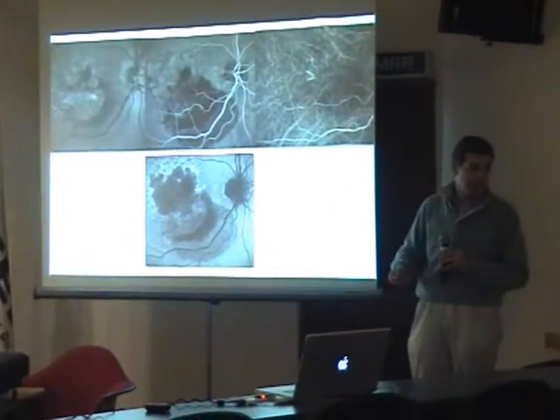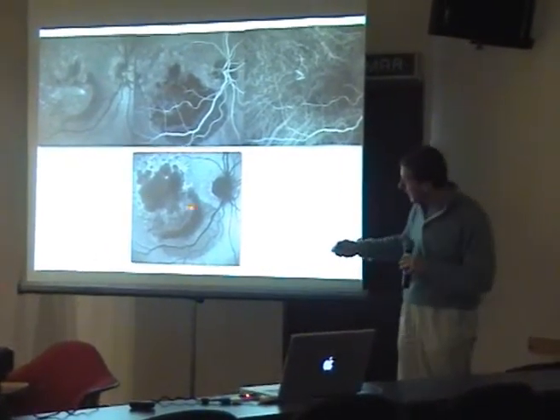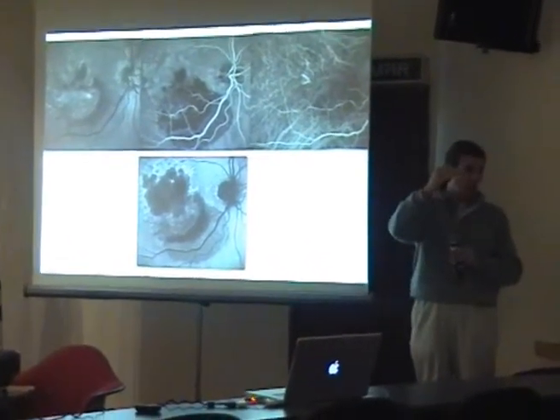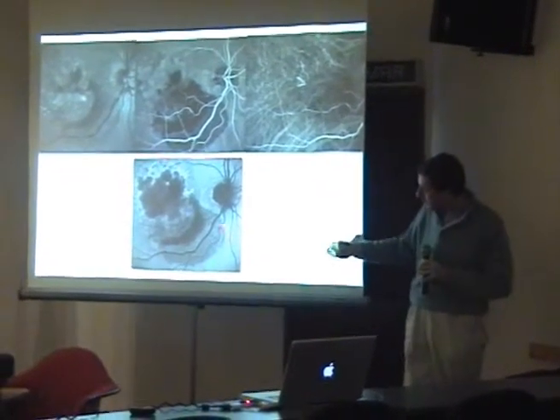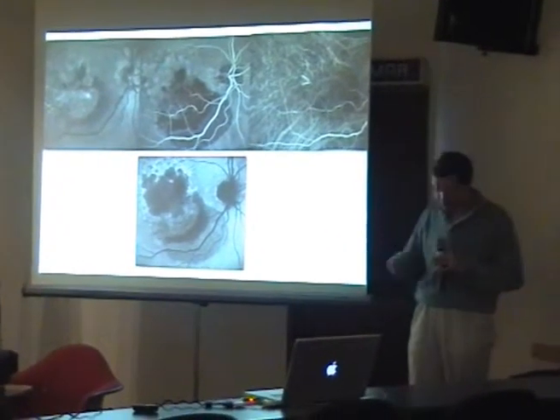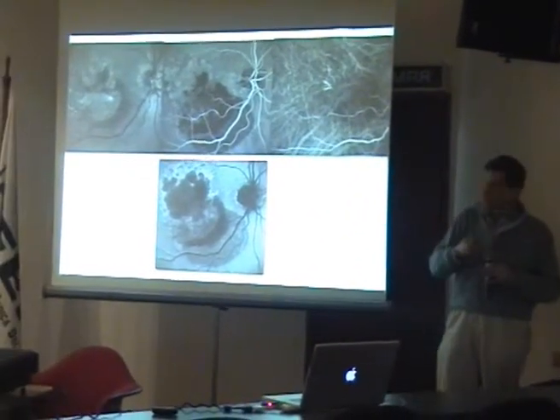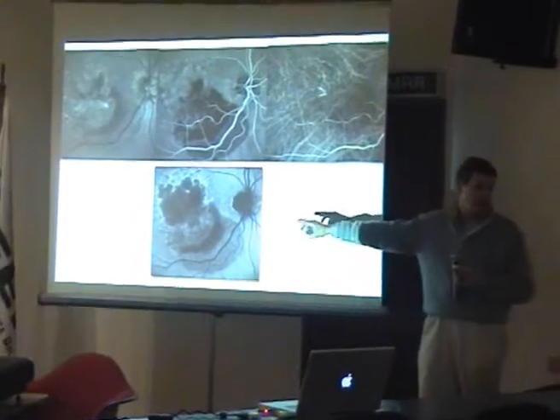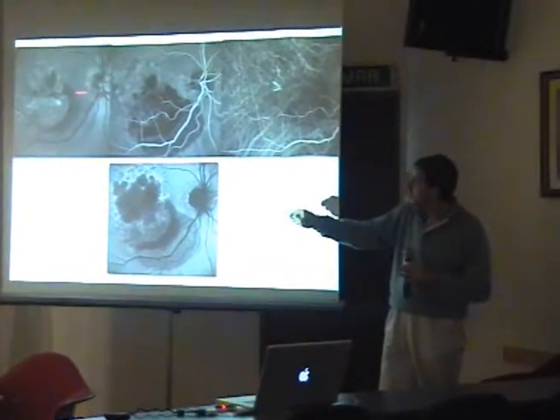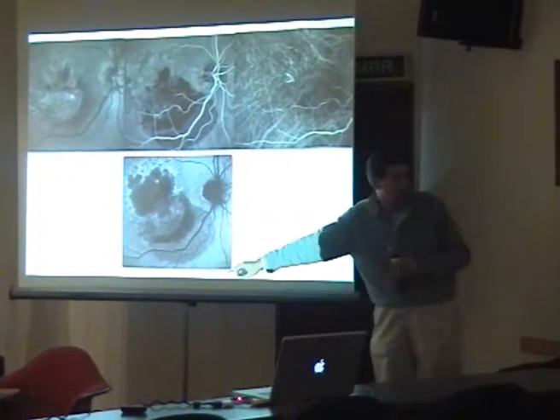An increased fluorescence. It means that probably the atrophy will increase in that area. Then I have here something, the blood, that is over the RPE. And here, there is fluid up to here, because they interfere with the fluorescence that comes from the RPE. I don't know where the lesion is, but I have more information, for example, the atrophy, that I couldn't get clearly from these images. And we didn't inject anything, we did before.